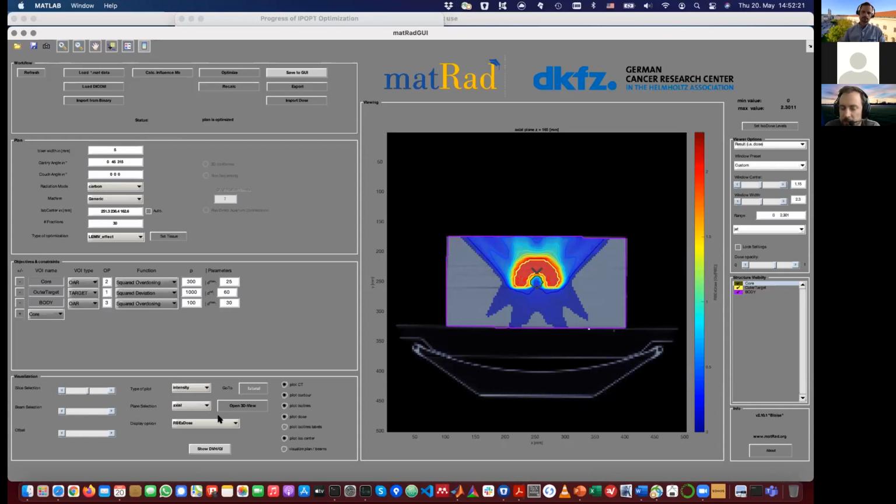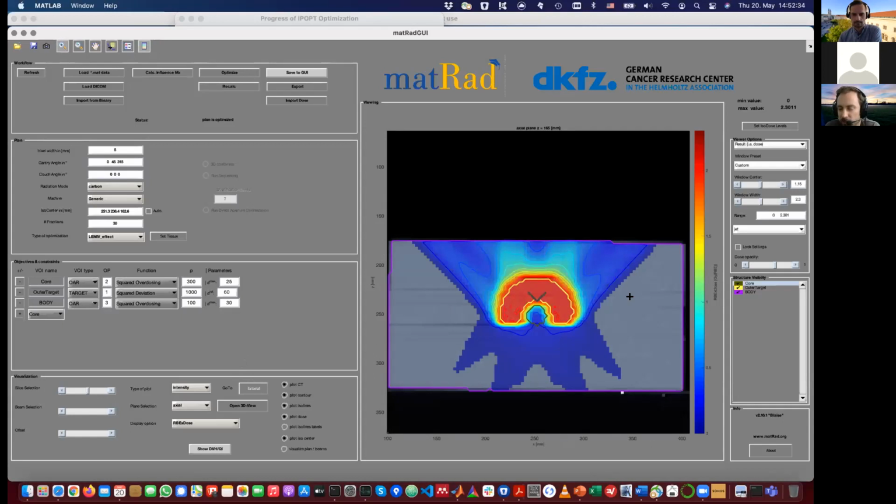So that's quite nice. But actually, we will include some models just because we are working also on using NTCP models directly in the optimization interchangeably for ions and photons. So that might come in the future, but at the moment, just choose one of these other excellent open source tools, export your dose there and try out the NTCP models there.